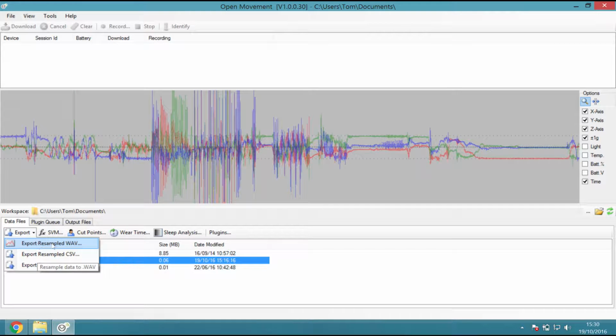We can export data into a WAV file, which is a standard audio wave recording. This option is very suitable for especially larger recordings that tend to be with a higher sample rate over a long period of time, because other formats are text-based and a WAV file is binary, which means the files are more compact and much faster to open in other applications.